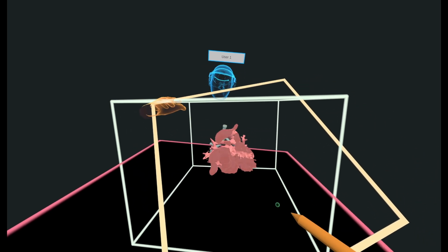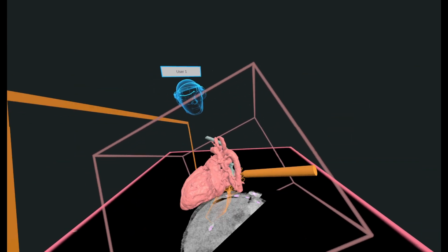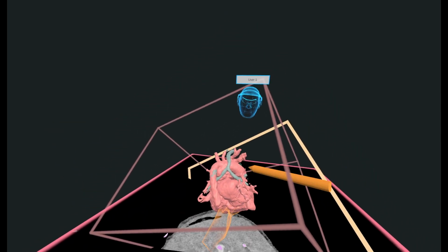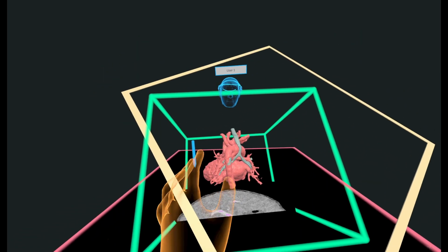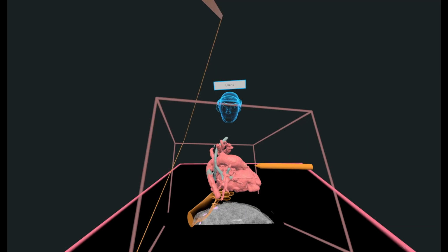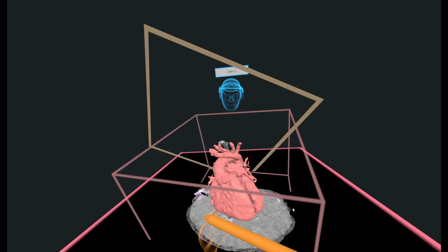You can see the large VSD. It's a left arch and it's a left SVC connecting to the morphologic right atrium. There's a large ductus, and this is a study pre PDA stent. And then we have that airway that we can see because the aorta has this very elongated horizontal anatomy. If we go straight AP, we can see how that shifts all the way posterior and from right to left.